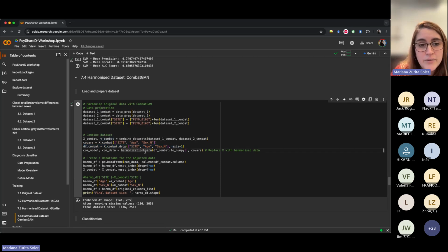And then NeuroHarmonize, that is the one that uses ComBat GAM, uses harmonization learn. You give the X data set where we have basically all of our subjects and all of the features, and these covariates that contain only the information of the site, age, and sex. You can add other covariates if you want as well.